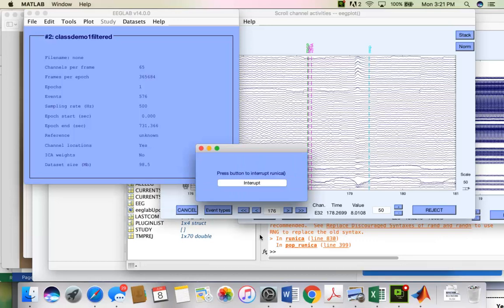It's a training algorithm. It does give me the opportunity to interrupt. I'm actually not going to do that, but I am going to stop the video. I'm going to let this run, and then I'll rejoin you with another video after it's complete.